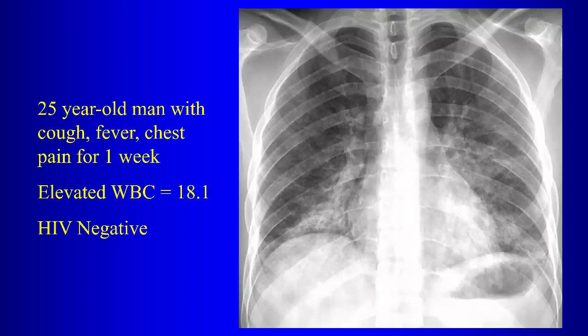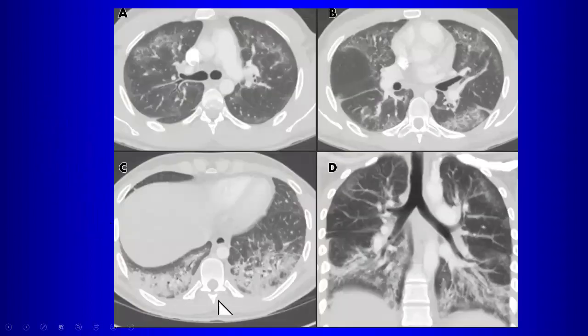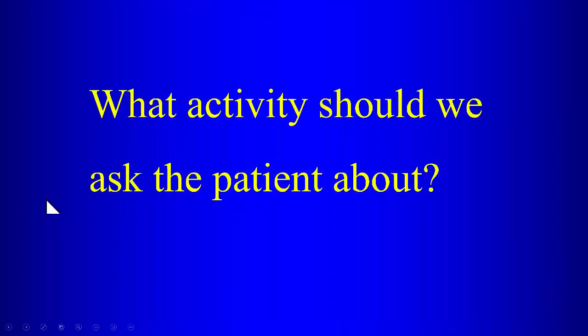We talked about opiate overdose, right? So that's certainly one thing. Vaping. Certainly something we have to ask the question about. Viral pneumonia, right? That's something we have to bring up also nowadays. Aspiration, if you have basal predominant consolidations, right? That's something else that you also have to suggest. Okay? So on the CT, we have these consolidations here, somewhat peripheral in distribution.